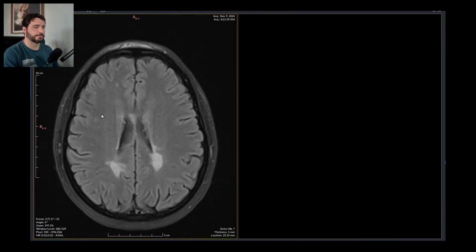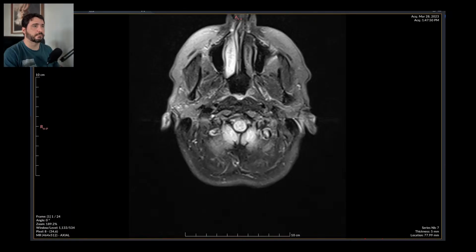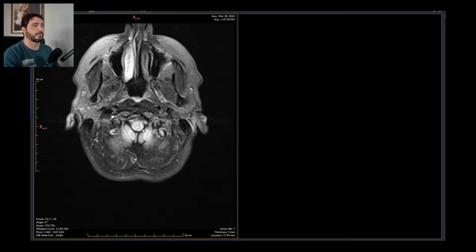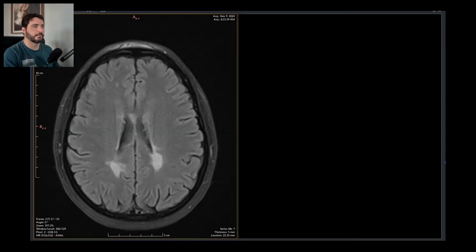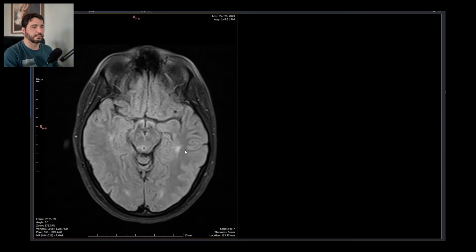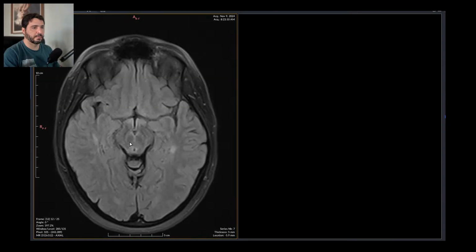This is March. So right there. There and there. That's okay. Let's see. There on the mesencephalon.